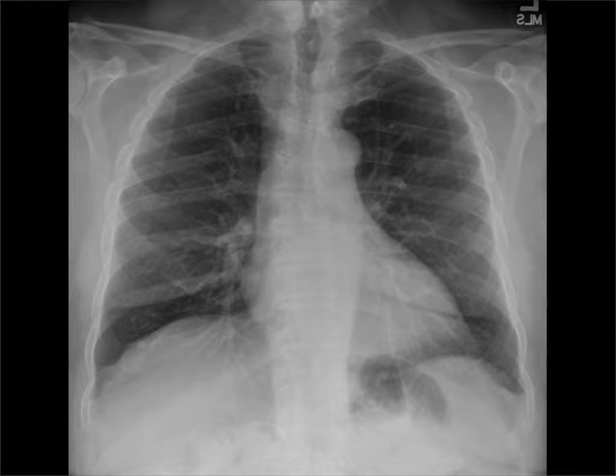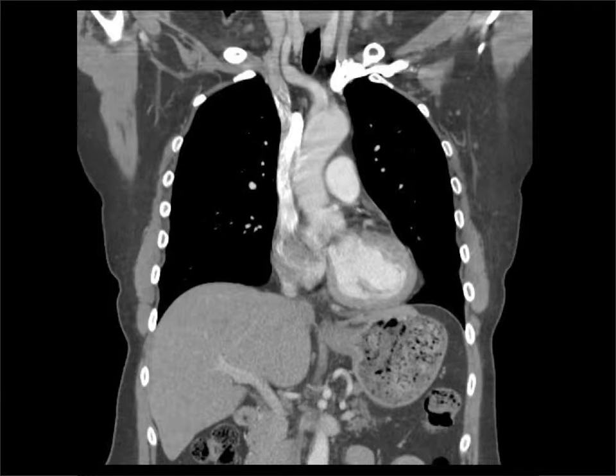So we're going to start at the top, at the most cranial end, and work our way down. You'll see that in the top of the mediastinum, we have some curvilinear structures like this. Depending on the age of the patient, these might swing out over the lung apices or not. When we look here at contrast-enhanced coronal CT through the mediastinum, we can see what makes those opacities. It's the interface between the air and the great vessels here. So we have the superior vena cava here, and we have the brachiocephalic vein there.